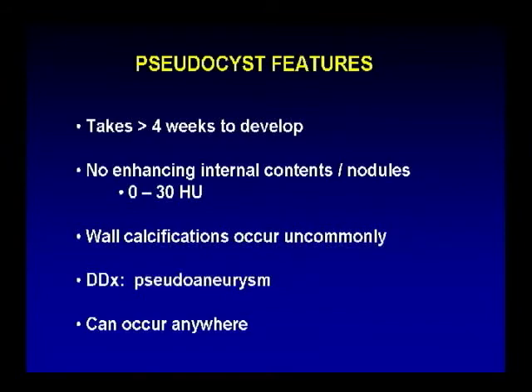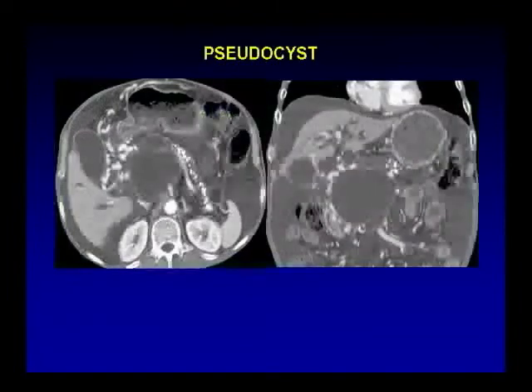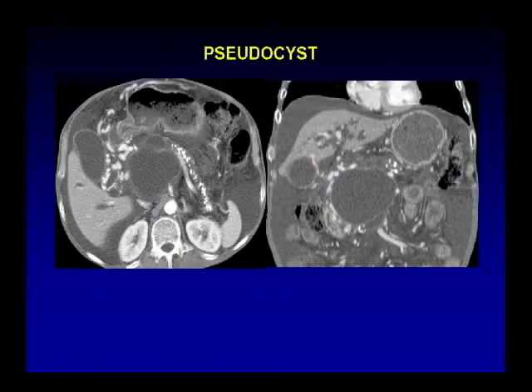And be aware, as you know, that pseudocysts, because they contain enzyme-rich fluids, can dissect through fascial planes and can occur anywhere. So here's a patient with a large pseudocyst located in the head. You can see that there's evidence of chronic pancreatitis superimposed on acute pancreatitis, a large amount of ascites, as well as dense calcifications outlining the atrophied pancreatic body and tail.